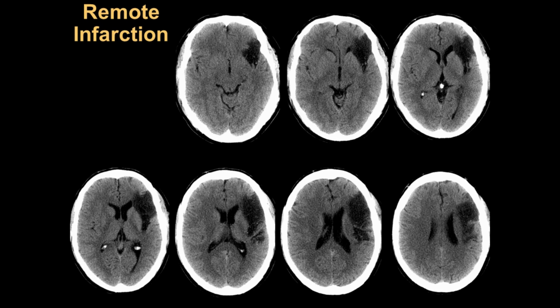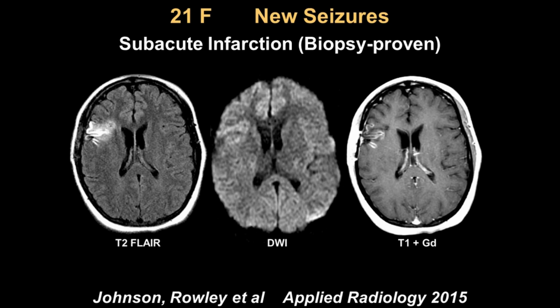We may also see older patients with new seizures. And if you tell me you have a 60 or 70-year-old with a new seizure over the telephone, I'll tell you the most likely cause would be an old arterial infarct. Not today's infarct, something that occurred a year or even 2 years ago, like this old left MCA infarct, presumably because of gliosis. We can also see it occasionally in the subacute setting as a cause of new seizures.